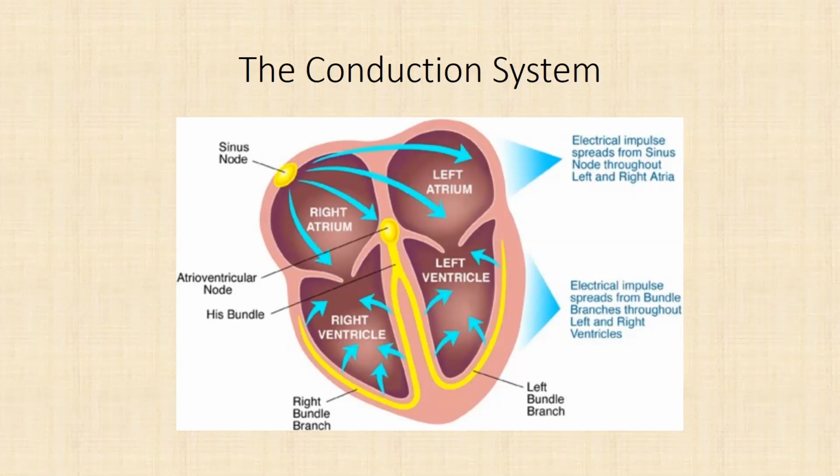Okay. So again, it's firing all over the atria. The SA node fires, and you get random firing all over the atrium up here. And then the ventricles fire off every so often. They filter out a few of them. They can't keep up essentially. So again, there's no P wave.